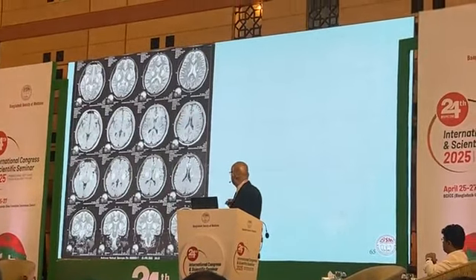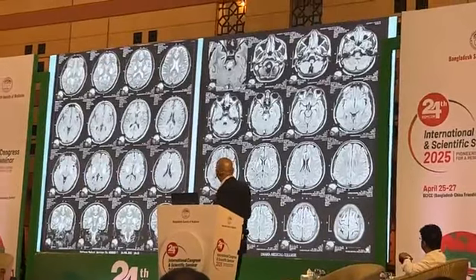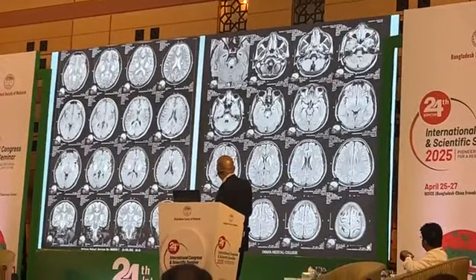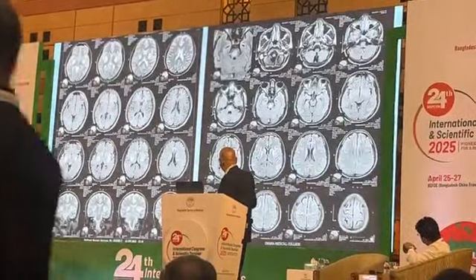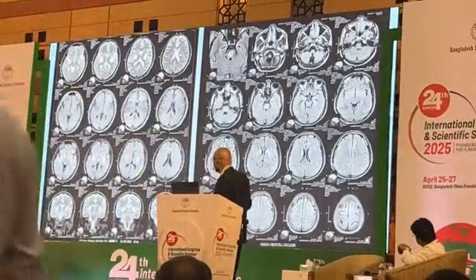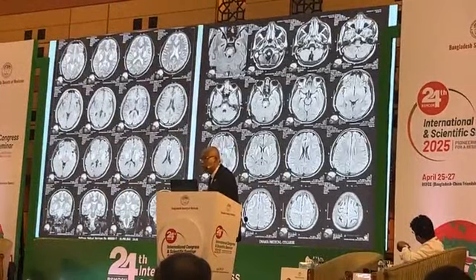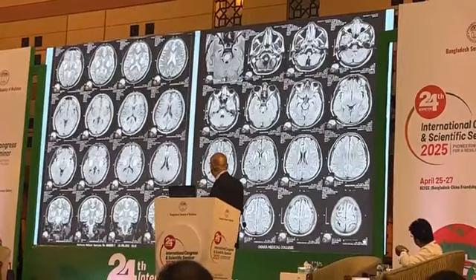Okay? This is that other patient that we saw with osmotic demyelination and central pontine myelinolysis. And we can see in the full picture, the patient had extrapontine bilateral basal ganglia lesions as well with CPM. The patient with CPM and EPM in ODS.